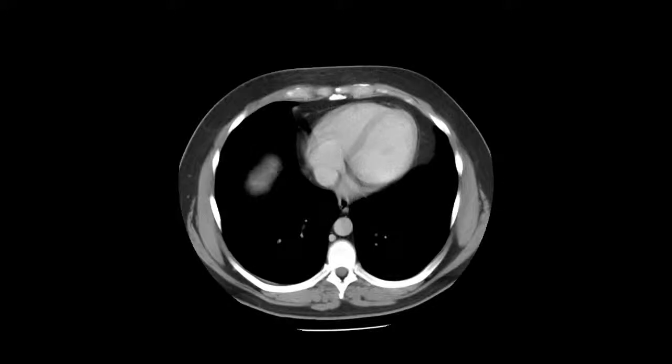Alright, let's start talking about a CT abdomen and pelvis and go through this together. This will take a little while, but I want to work through this because what you will likely see on board exams and other places is a CT slice, and then they're going to ask you either what the structure is or something related to the structure. So let's go through how to read a CT of the abdomen and pelvis.